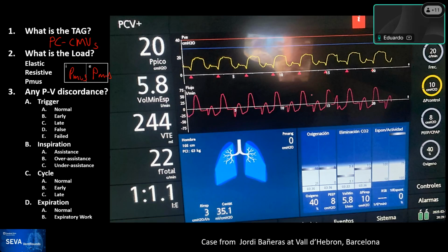I wanted to highlight that sometimes these graphs are very good when you're seeing 5, 10, 15, 20, 25 seconds of ventilator tracing. So sometimes it's important, when you're trying to ascertain what type of interaction is happening, to change the amount of time that you're displaying in your waveforms, and that will make it bigger. When you make it bigger, you have a better ability to recognize those interactions. Now I saw questions flying, but we're going to address expiration in a second.